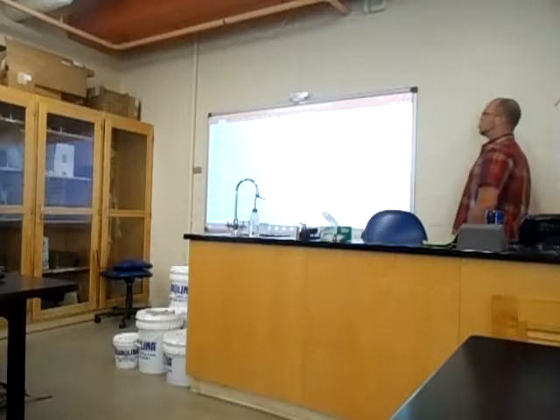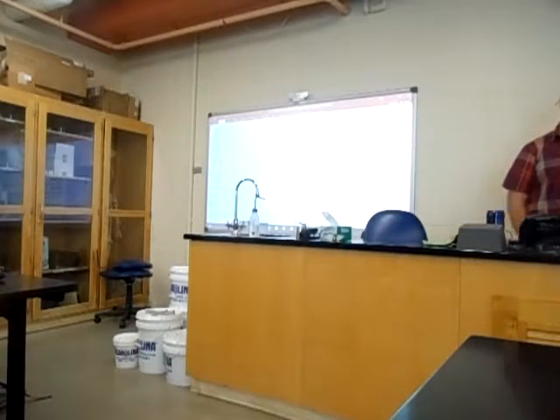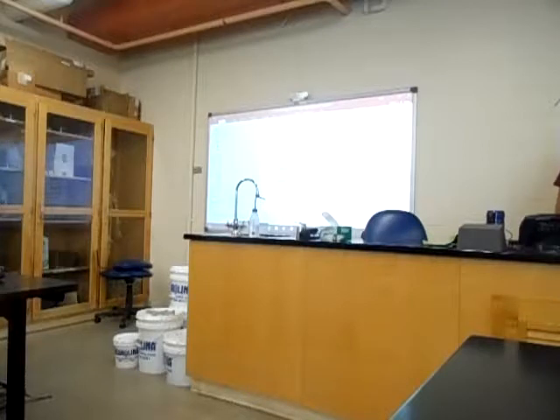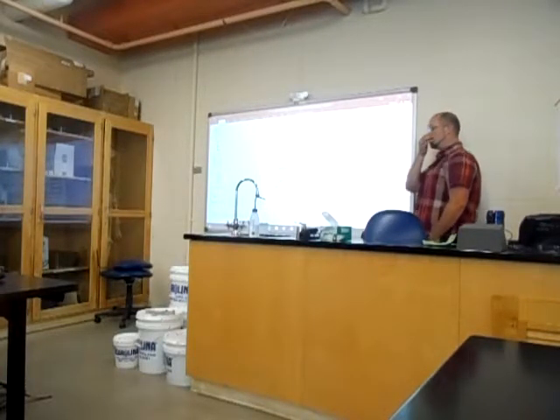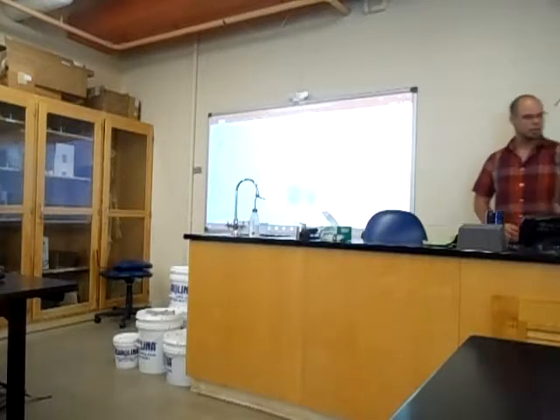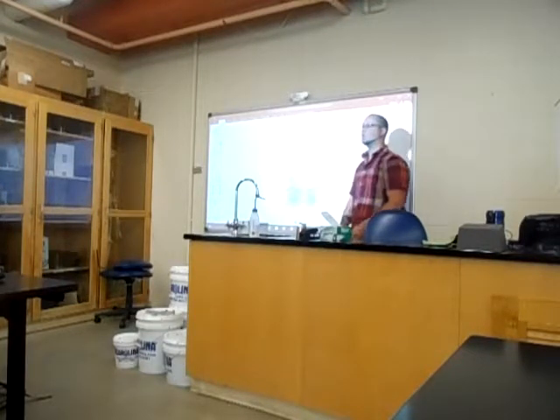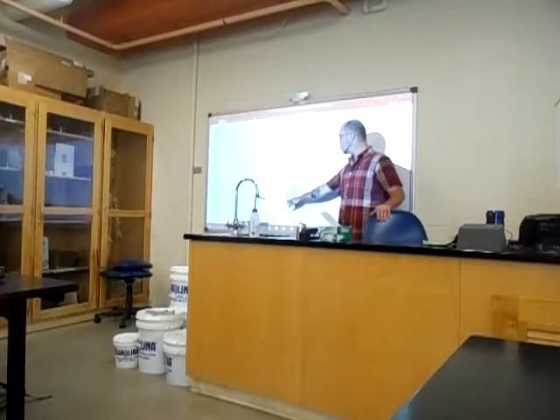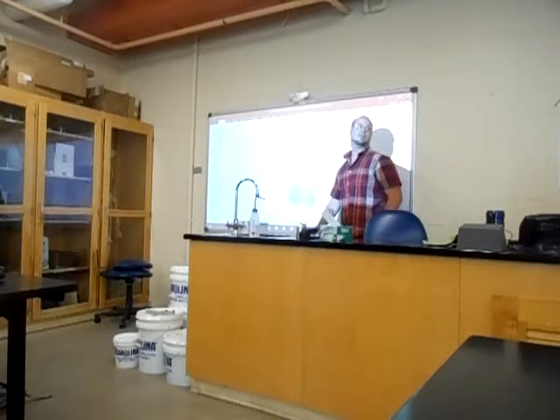We can take certain measurements on an ECG reading and interpret what that means based on what we see. So the first one up there is the PR interval. The PR interval is measured from the beginning of the P wave to the beginning of the QRS complex. So if I pull up our ECG reading again, I think it was actually marked on there. Here's our PR interval. Beginning of the P wave to the beginning of the QRS complex. And what that's telling us is the amount of time between when the atria begin to contract and when the ventricles begin to contract. Okay?